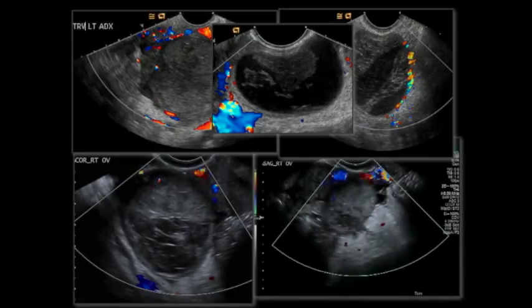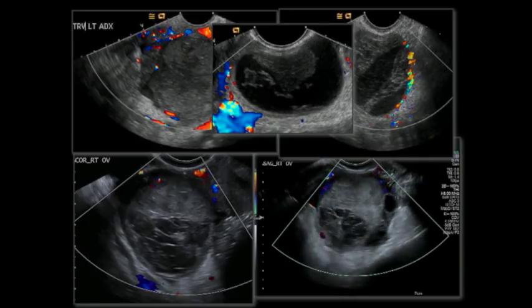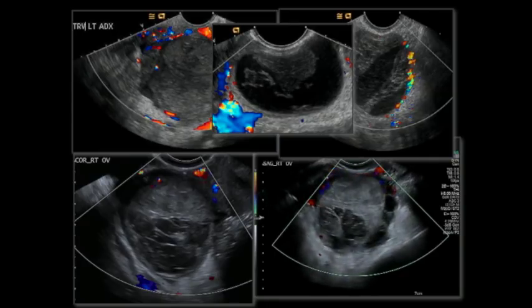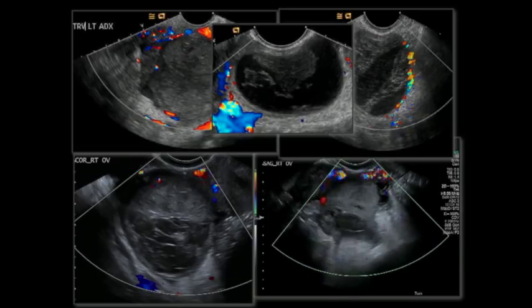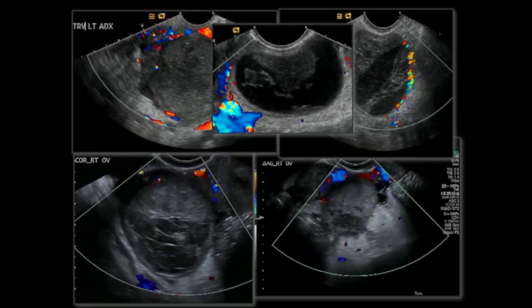In the next case, there was both hyperacute and a little bit older blood noted within this hemorrhagic cyst. If you're not familiar with this appearance, unfortunately, this was misinterpreted as a dermoid, with the more echoic part being the possible fatty component, and these fibrinous bands representing the dot-dash pattern. And then it was thought, well, it's so big and there's acute pain, perhaps this represents torsion, and it was misinterpreted as an ovarian torsion, which does happen.